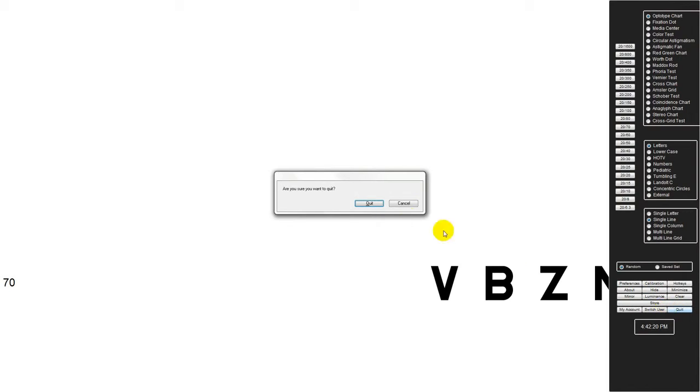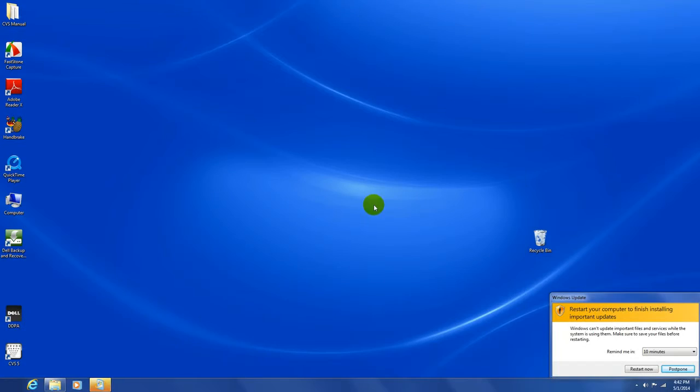That's basically it as far as that is concerned. I'm going to quit the program. It asks, are you sure you want to quit? You hit quit. And I just want to make sure we didn't change anything. So that's what we were doing.